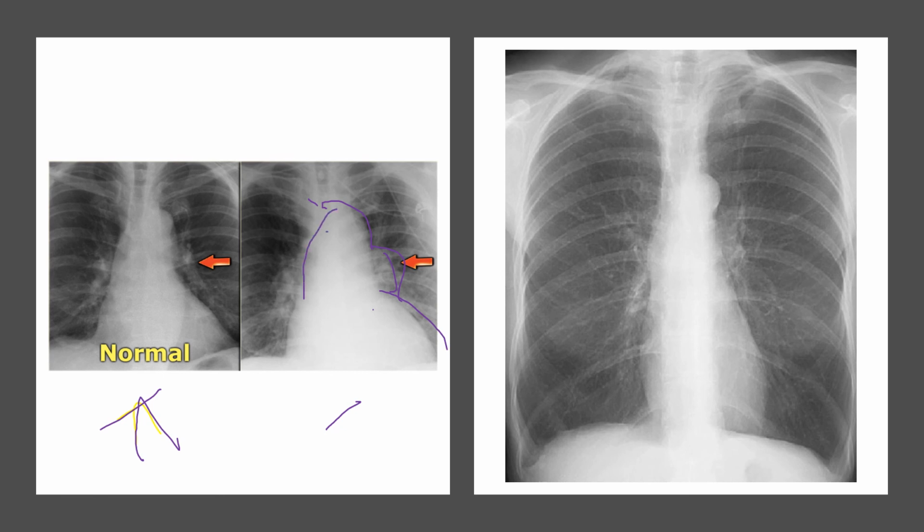A lot more density value. There's a lot more hilar infiltrates too going on. This pulmonary edema, this is heart failure, so this would be cardiogenic pulmonary edema going on over here. So you see how much bigger the cardiac space is taking up compared to the thoracic size. So that's what you're looking at there.